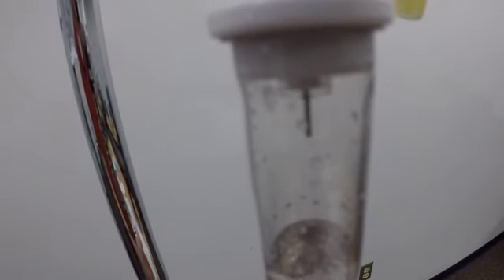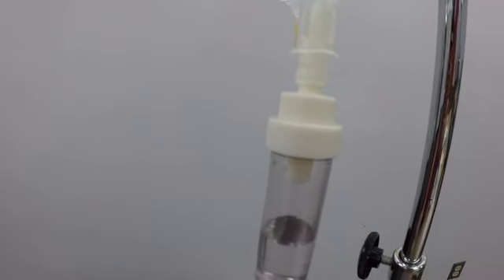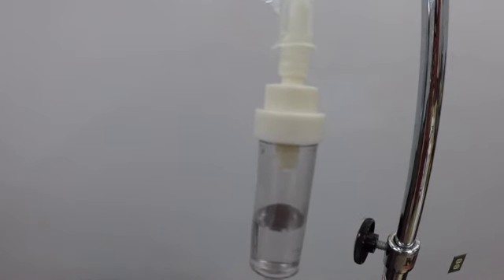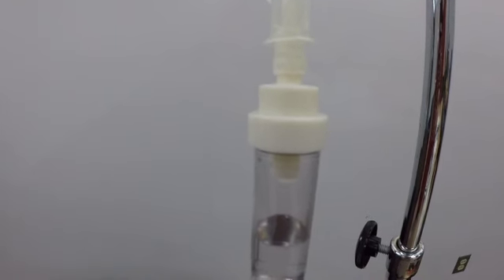So this is the difference between the macro drip set and the micro drip set. Micro drip set, mostly for infusing medications, maybe for some pediatric patients or a patient where we're going to be really careful about how much fluid volume we give them. Not blood, that's another video, but how much fluid we give them. And the macro drip set is either because they need IV fluids, or they might need IV fluids but not yet, so we're going to set the drip to keep vein open, or a drop every 10 or 15 seconds. Or we're using it to give a medication that we're going to run fluids into after.